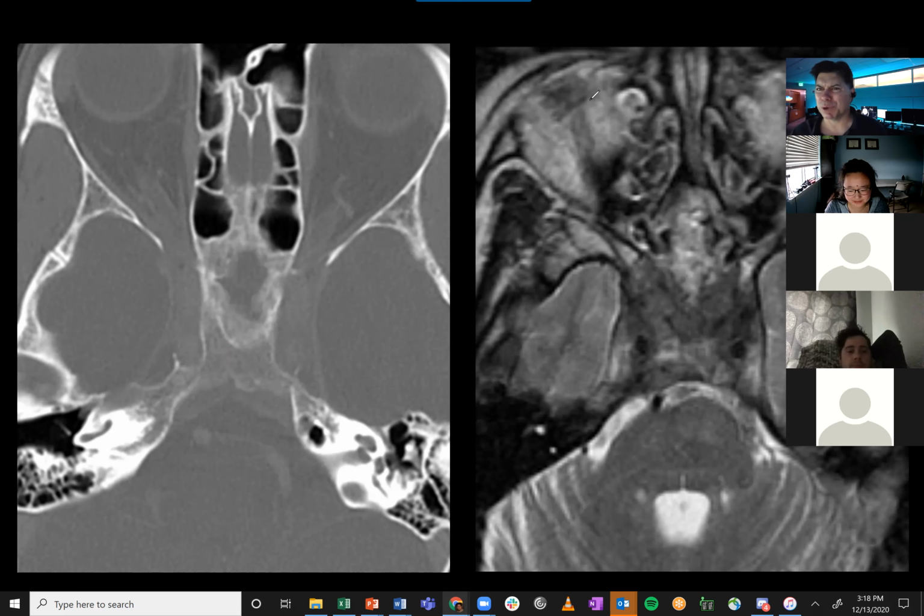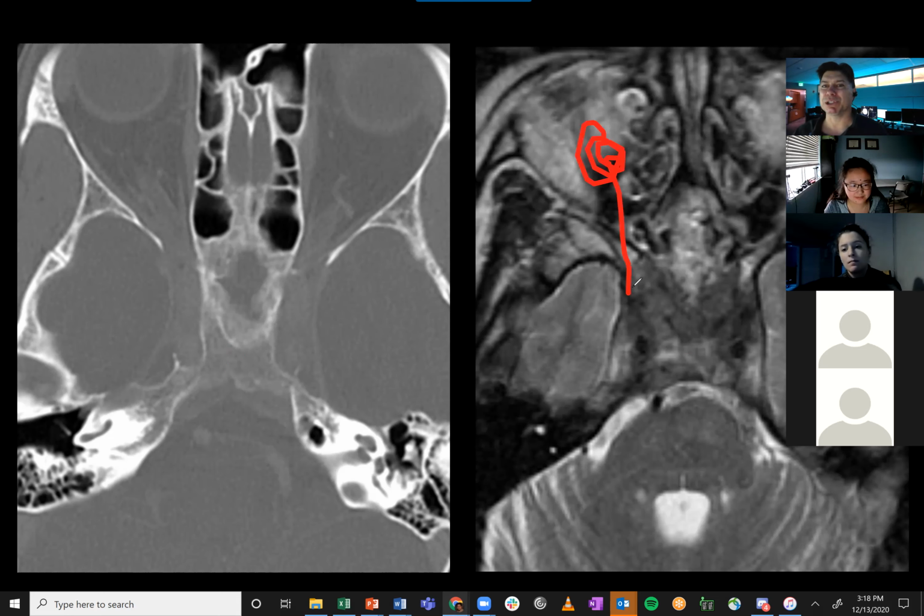If this hurt really a whole lot, we might think about a low-grade idiopathic inflammatory process like Tolosa-Hunt. Usually that's just on one side. We think about that like IOID in the eyeball. It's just extended back into the cavernous sinus. Tolosa-Hunt or IOID, pseudotumor, that might be a low-grade idiopathic inflammatory process of the cavernous sinus. But that would probably be our differential on a case like this. Good job. Okay, next case.